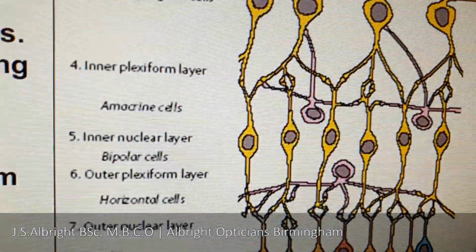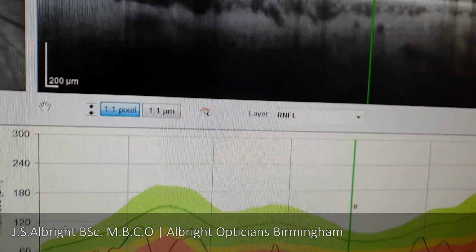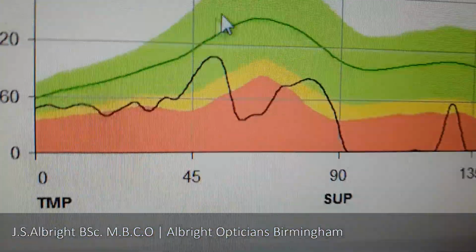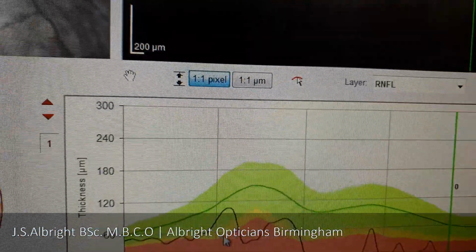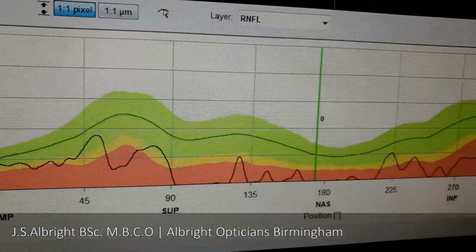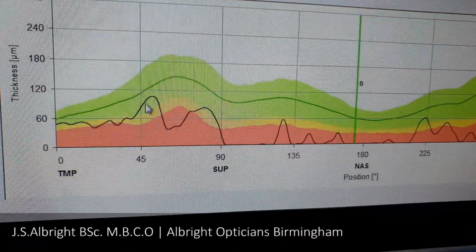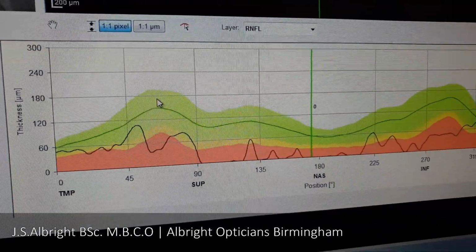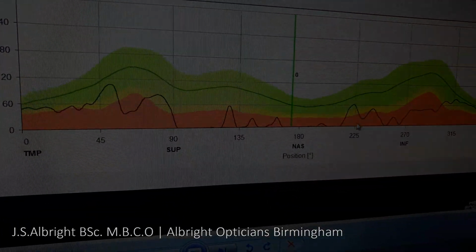And glaucoma, advanced glaucoma looks like this one. So we can see the nerve fibre layer has almost disappeared. This is a patient that has had glaucoma for many years, and this is where we get this trace at this stage. The idea is to pick cases up of glaucoma far earlier than when they get down to that level.